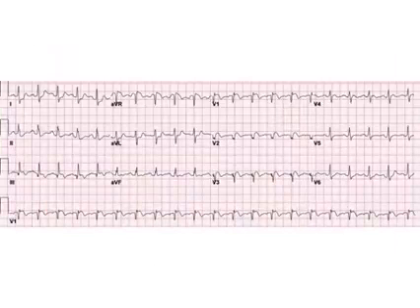Let's move on and talk about some other really, really high-yield ECGs that don't get a lot of love in other review sources, but I think you should know because if you can pick them out and correlate them to something in the vignette, you're giving yourself free points.